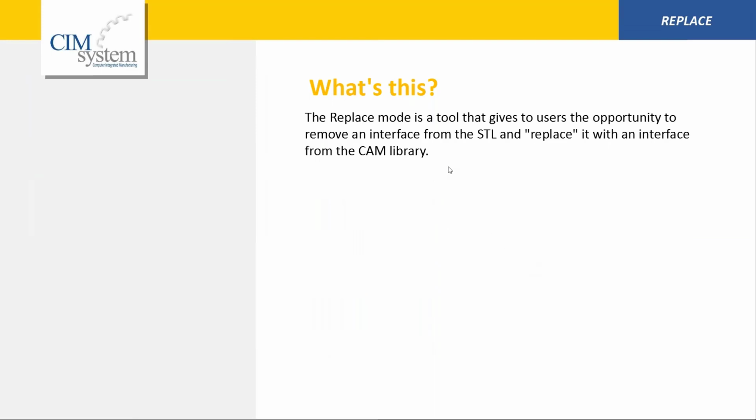But replace, we are talking about replace and designing a new connection with Implant Editor. The replace mode is a tool that gives users the opportunity to remove an interface from the STL and replace it with an interface coming from a CAM library.